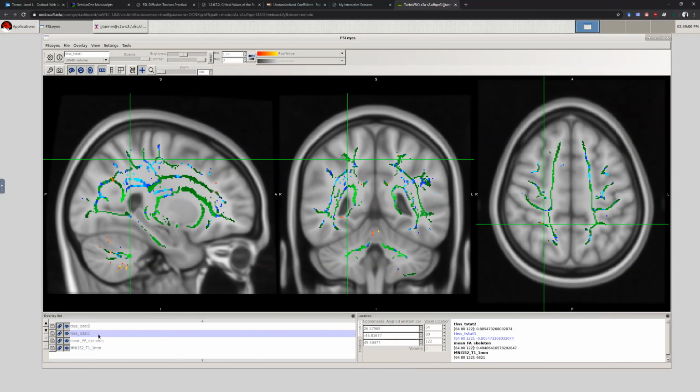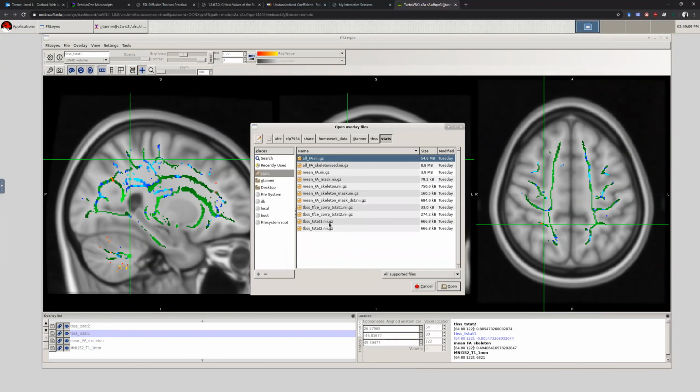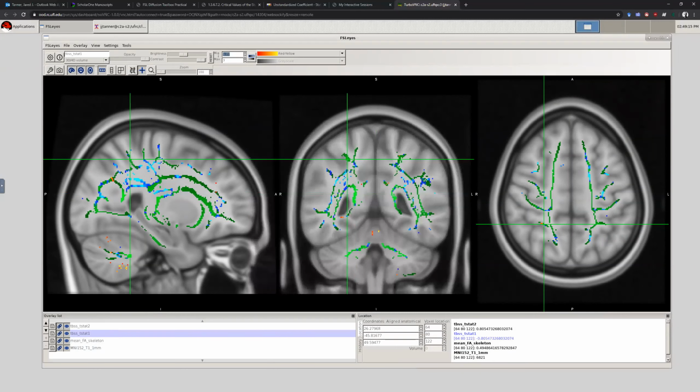And so what we do is threshold this. Again, if you were loading these data in manually, you can go to File, Add from File, and we can load them in, tstat1, tstat2. Maybe we'll do that for the TFCE ones. And then here are our min and max values. So min, if we put that down to 0, what do we expect will happen?